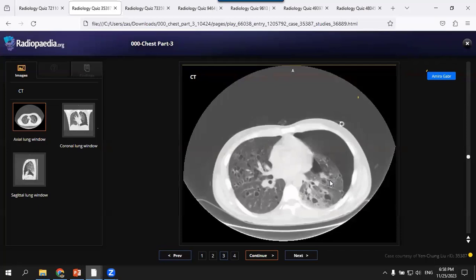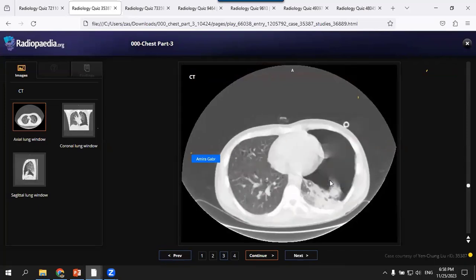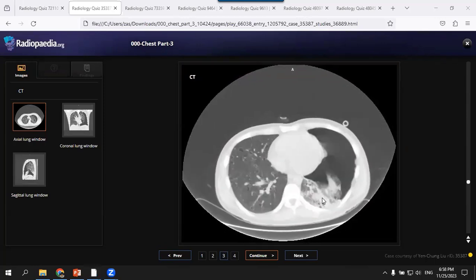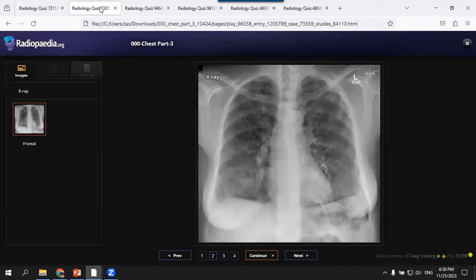Yes, sir. And also these are bizarre shaped lucencies, so I'm thinking much in terms of Langerhans cell histiocytosis. Apart from that, I also noticed there is an area of basal consolidation on the left side, basal collapse consolidation on the left. Very good.